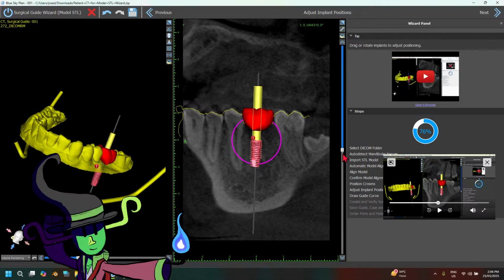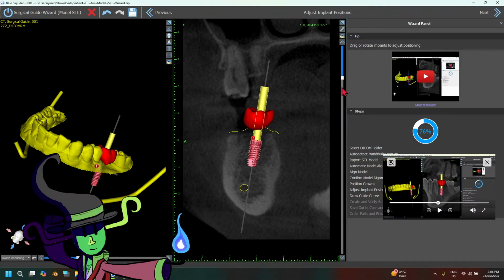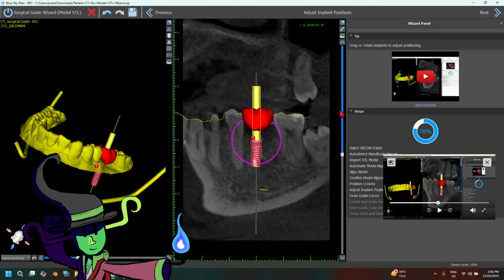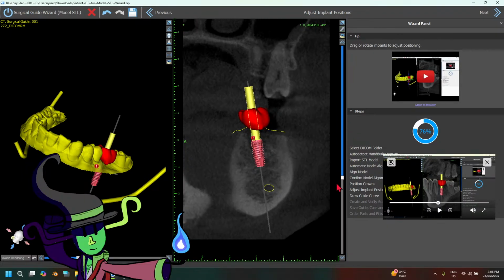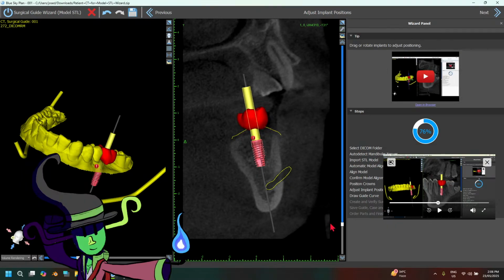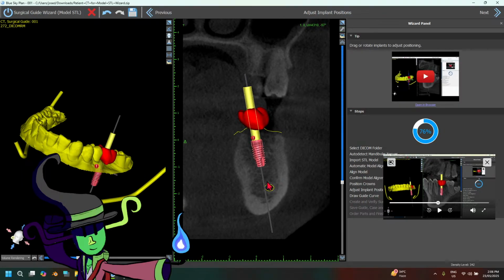Alright. So I think it's giving me a tangential view of the implant here. And I think from here we can rotate our implant around to make sure that it aligns within the bone of our patient. And so far our implant seems to be good. It's not going to puncture a hole in the mandible that would take it from here to here or something.